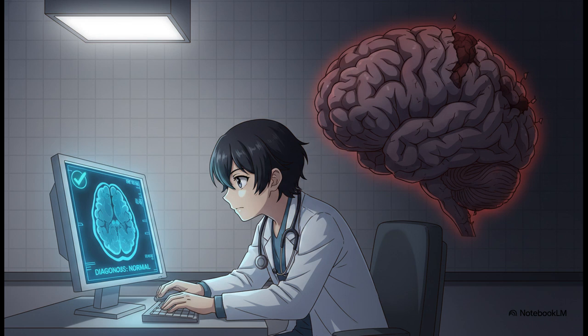Now we're going to talk about what might be the most insidious injury of them all. It's one of the most severe, but it has this terrifying little feature. The first scan can look completely fine.